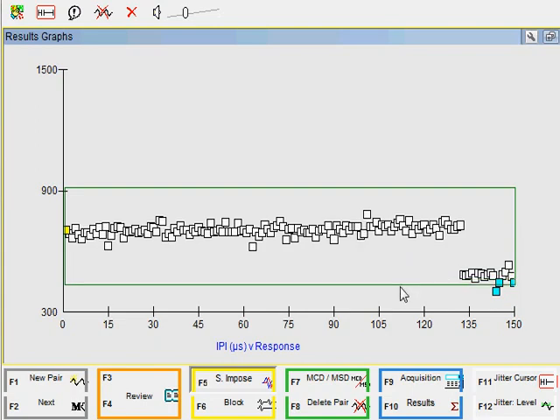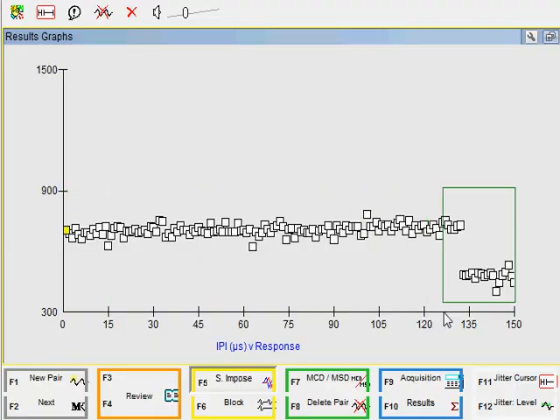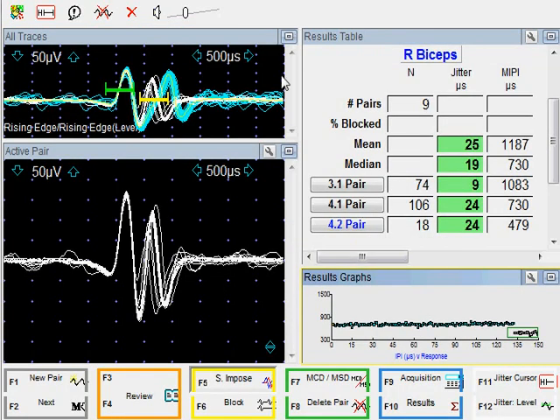I'm going to drag this window down up to here, and perhaps I can bring the left edge. You can move any edge whichever way you want. So now I have selected the second action potential pair for measurement. Now we can see the earlier potential used for analysis. Those traces are seen in white color, and the first recording that we did is shown in blue color.